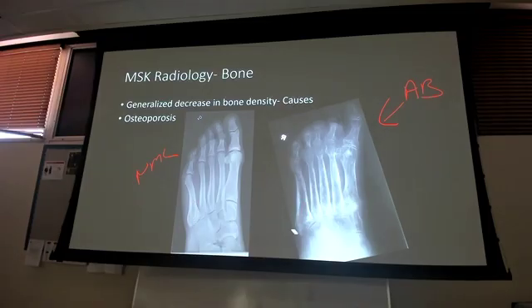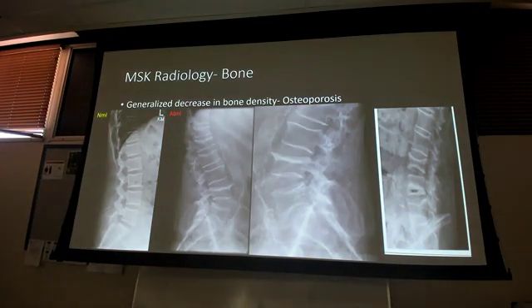Now, is that cortex bright or white? Is there something going on? Are we having increased activity there? Maybe. Or it also could be the fact that because of the radiodensity differences and how radiolucent the medullary bone is, it's making that pop just a little bit more. It's like putting things next to each other, right? But this is your sign. It's more inside the bone. And we'll see some more pictures of this primarily in the spine as we go forward. And I think that is next, okay?